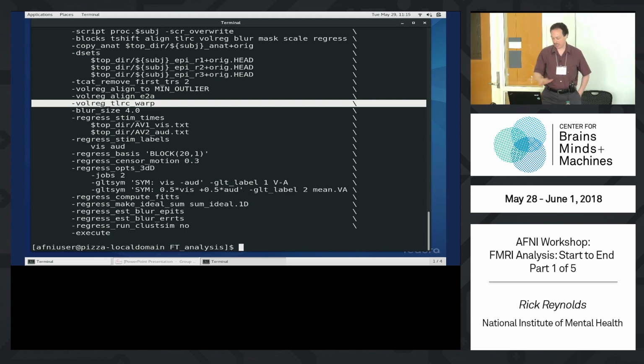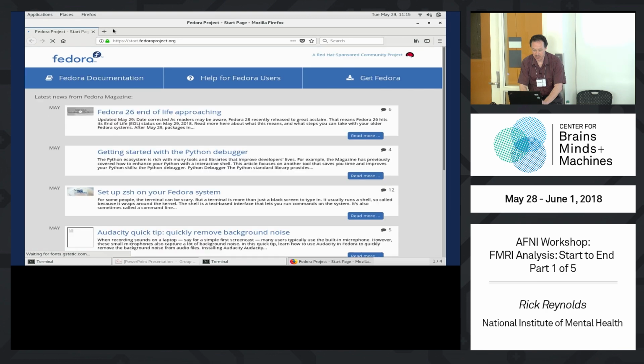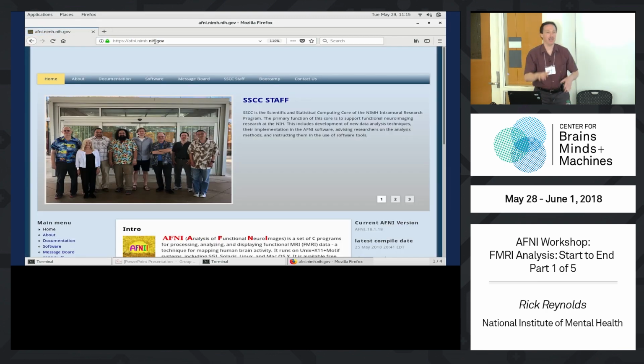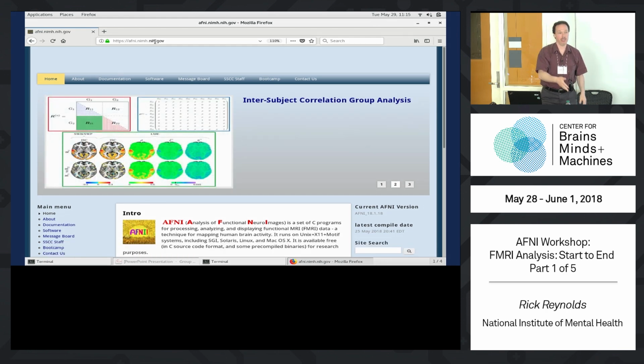And as long as I'm on that, let me just point you at that briefly, because I don't think we looked at those help pages yet. You don't have to do this, just watch a second. If we go to the AFNI website, you can type afni_proc.py -help, but it's going to show you, I forget how many thousands of lines long that is. It's a lot of help to search through.